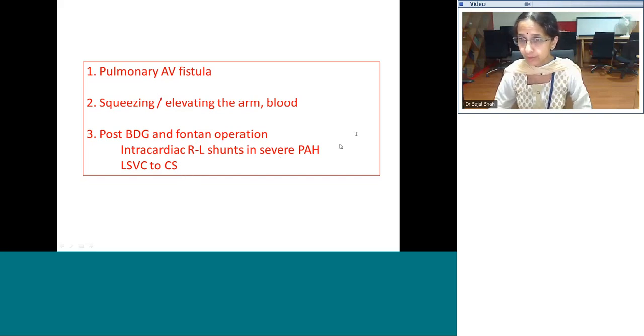I get one answer, right pulmonary. In a way, we are telling that it's a sizable pulmonary arteriovenous malformation. So I think it's understood, and now we will go to the second question. So this is how our flow will be. We'll be playing the video first, and then you will have a set of questions. And if anybody has any extra doubts, you could chat it.